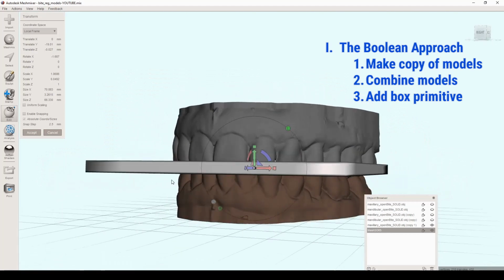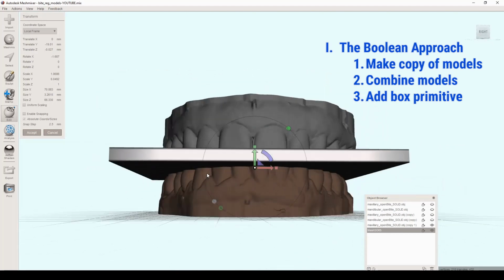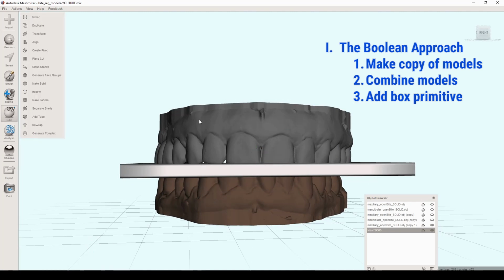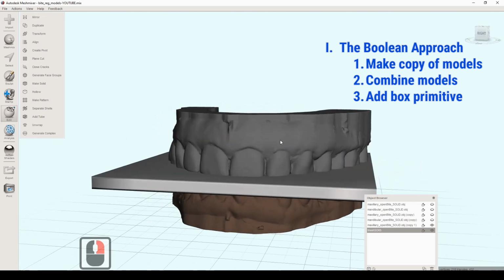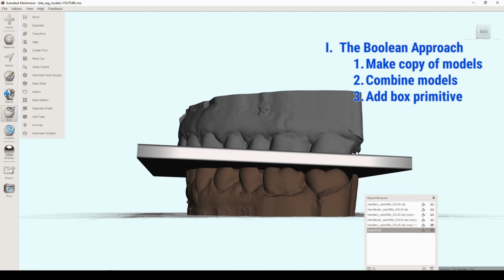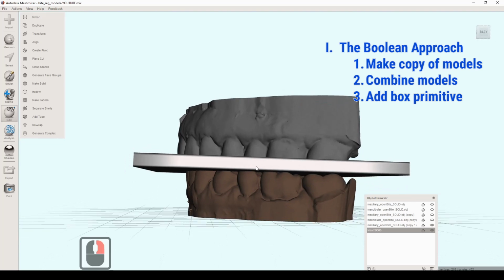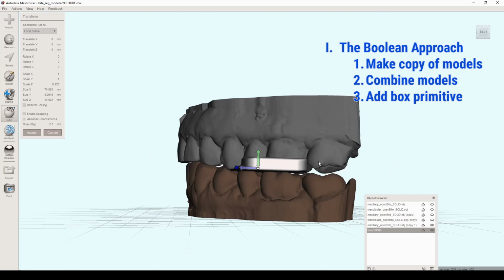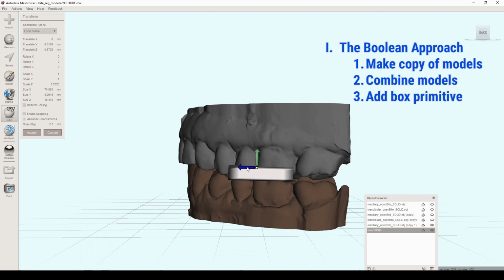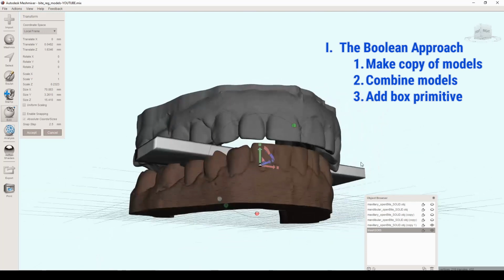It's a little skewed here, but you know what? I think that's going to be fine for this purpose. So we're going to go accept. I could have rotated that slightly, but it really doesn't matter. I just need to make sure that it has just the incisal edges and not past the height of contour of either arch. And I'm going to shorten this in this direction here, make it just a short stick. Bring it right midway into the arch. It's really all you need.